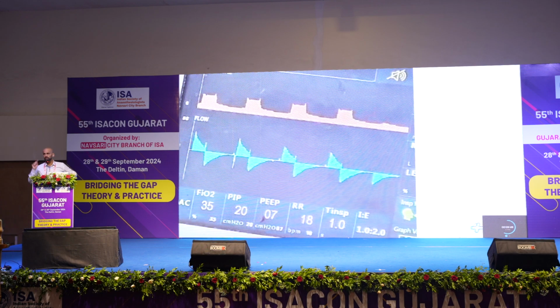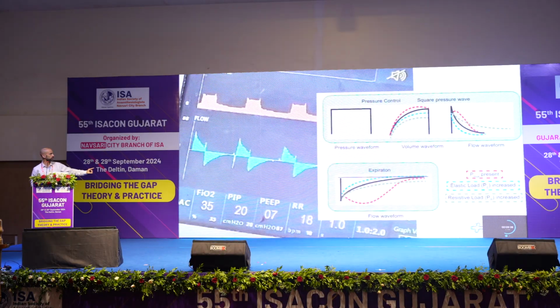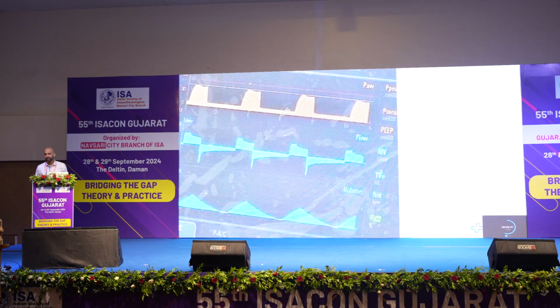So it's pressure control. The pressure time scalar is roughly a square wave. No confusion. Look at the pattern on flow. Decelerating pattern, exponential decay. I don't see any major problems. That's your pattern now. So this is an elastic load on pressure control. That's your load assessment.